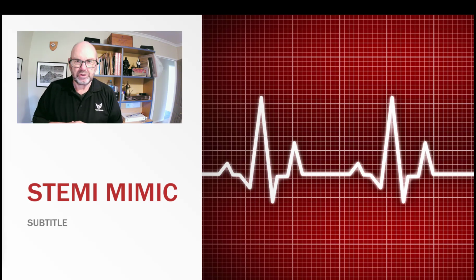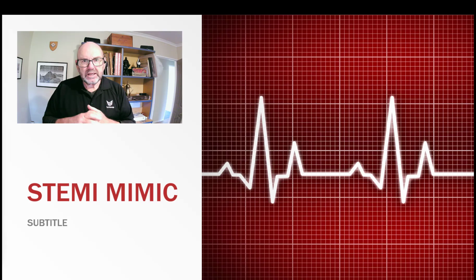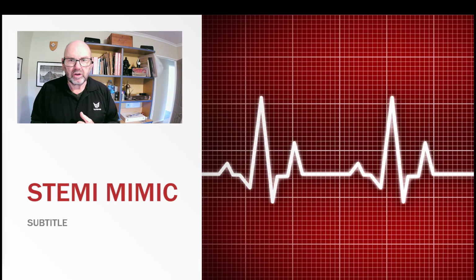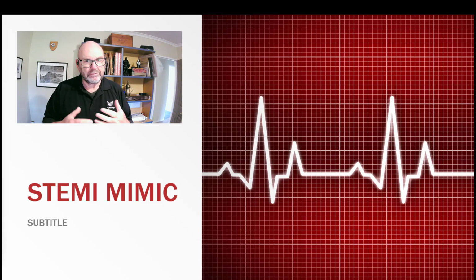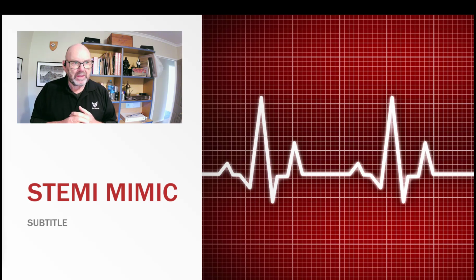And if you've made your way through the book, you'll be aware that the basic approach that we have to considering any STEMI mimic is to ensure that it's not an MI first. So clearly we need to be looking for whether the changes are regional and whether there's reciprocal changes. And if this is not the case, or there's other clinical indicators to suggest that it's not an AMI, then we can start thinking about what potential STEMI mimics there are.